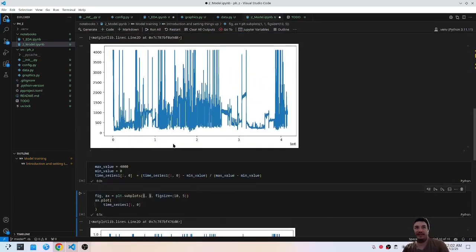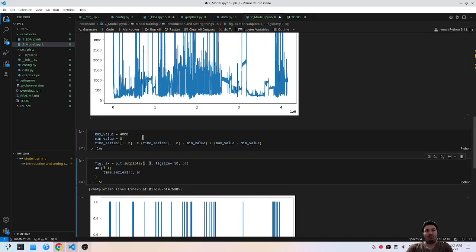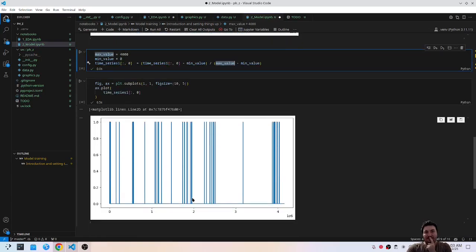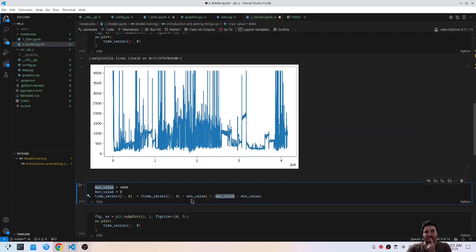Okay, and then why do we have this? 4,000.